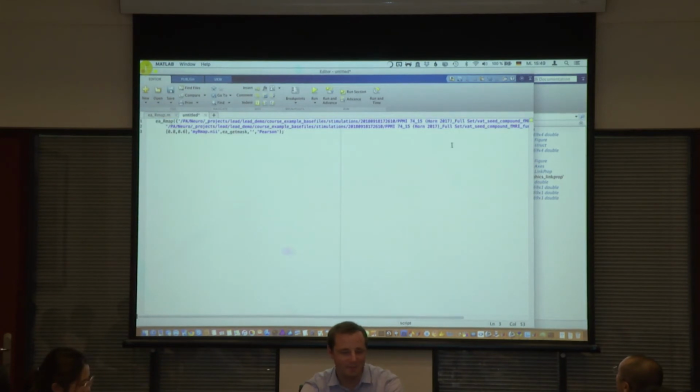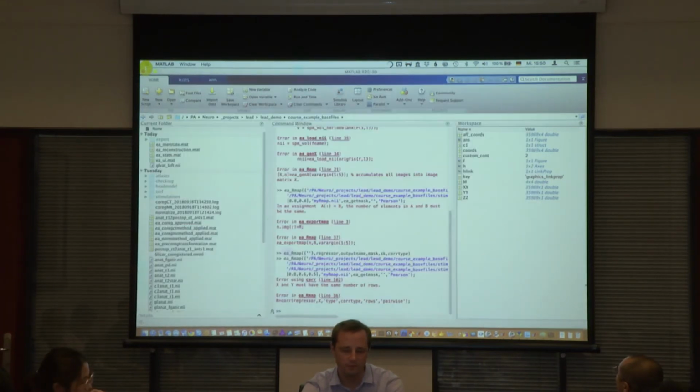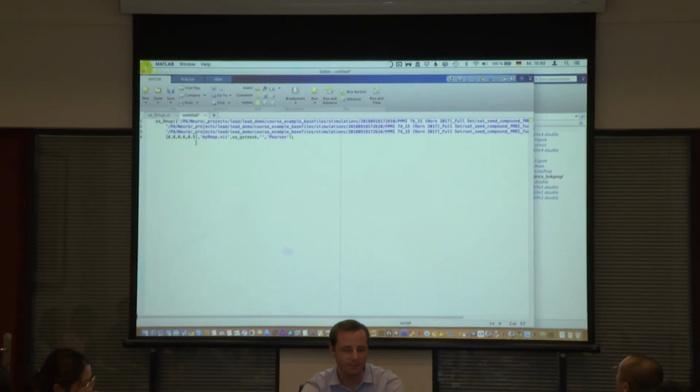So the problem is probably that we have supplied the same image 2 times, but let's try if we do 3 times, then it could work. Probably need a reasonable number.